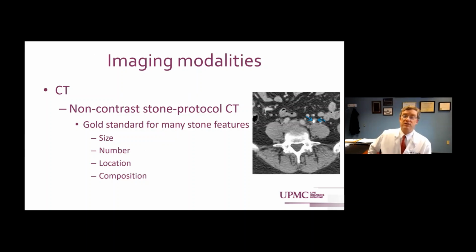And certainly, you could almost say, well, okay, CT scan, we're done. That's certainly the gold standard for imaging of kidney stones, and it's probably the best with respect to looking at all the different factors I just mentioned. But not the only thing, and it does have its disadvantages. So we'll talk a little bit about what it's good for and what it's not good for. But as noted, it is excellent for detecting size, number, location of stones. We'll talk a little bit more in a second about composition.